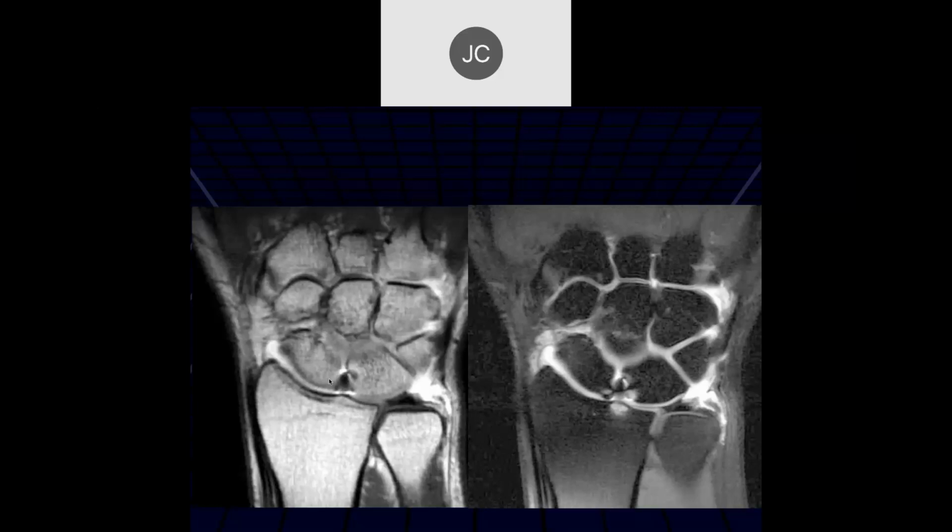What we're seeing here is a metal artifact with a scapholunate repair maybe. So this patient had a scapholunate ligament tear, probably with some remodeling due to the abnormal forces. This is metal artifact emanating from a scapholunate ligament repair.